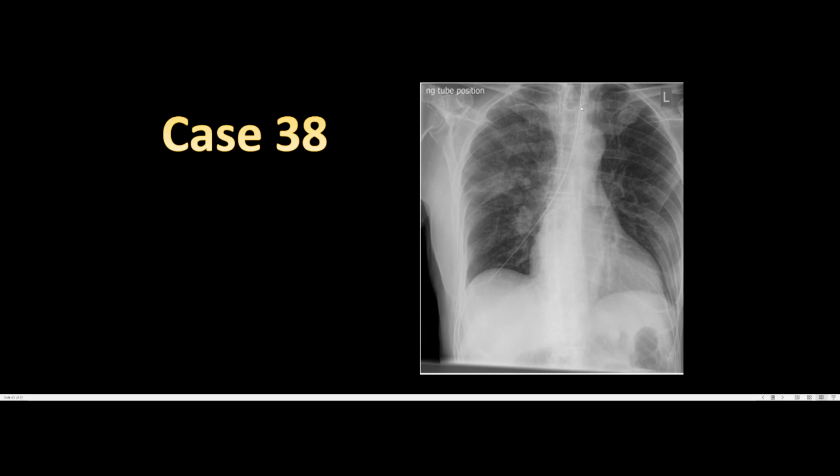But here we can see that the nasogastric tube had gone towards the middle and then it's deviated. It looks like, unfortunately, the nasogastric tube went inside the trachea. So it went towards the carina where it will go towards the right mainstem bronchus, and this is bad because it will eventually reach the right lower lobe, and this can lead to complications. This can lead to right lower lobe and middle lobe atelectasis. It can lead to lung collapse, not pneumothorax, atelectasis, and that's another video for another time. But the abnormality is that there is improper nasogastric tube placement.